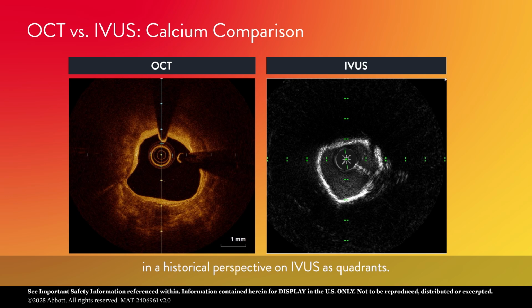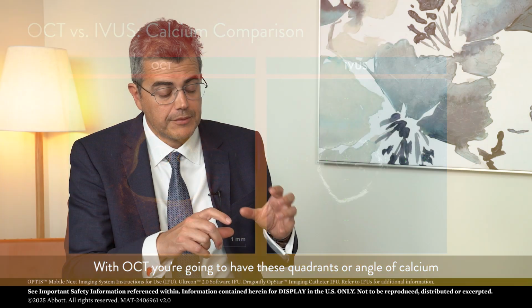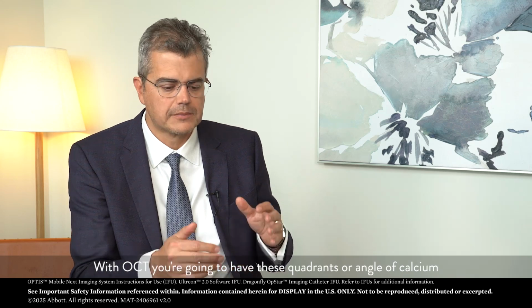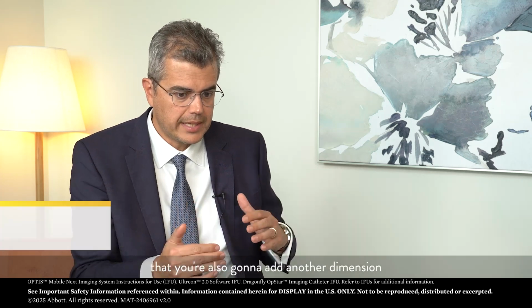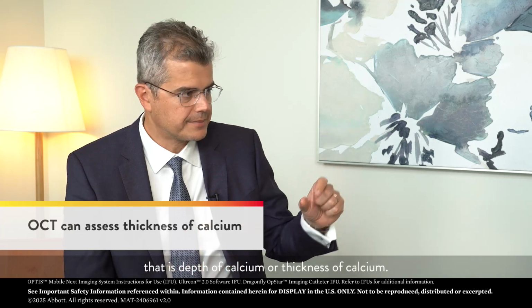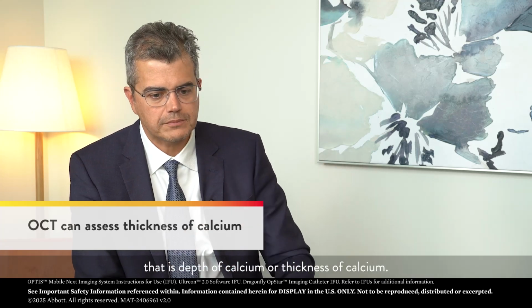So calcium you identify in a historical perspective on IVUS as quadrants, right? Because remember, the ultrasound cannot penetrate calcium, so the only thing you can talk about is 1, 2, 3, or 4 quadrants of calcium. With OCT, you're gonna have these quadrants or angle of calcium, but you're also gonna add another dimension that is depth of calcium or thickness of calcium.